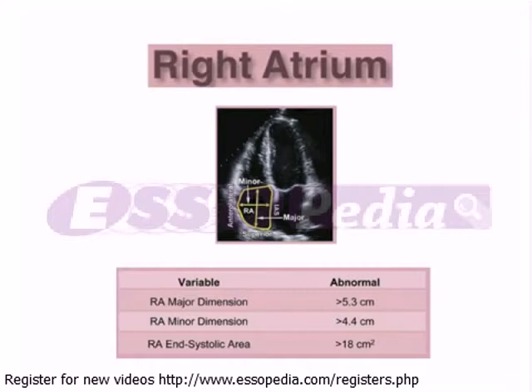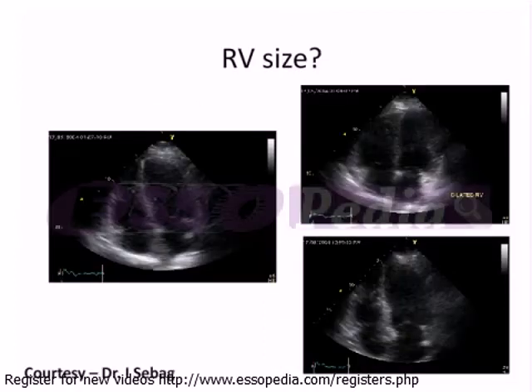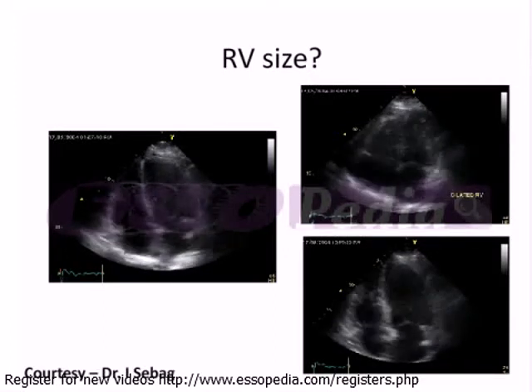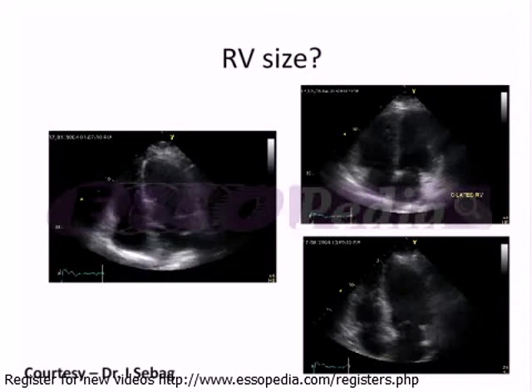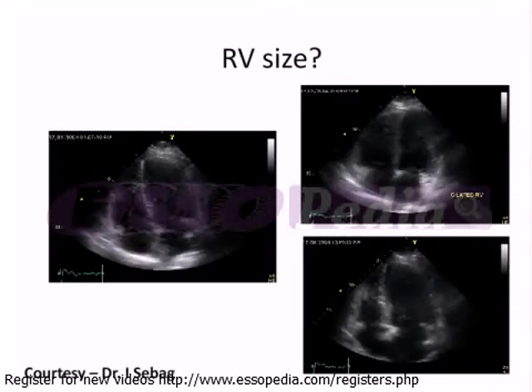Another important and seemingly simple measure of the right ventricle is the right ventricular size, yet practically the assessment of this is not straightforward. It can be measured in the parasternal long axis and parasternal short axis with an upper reference limit of 26 millimeters distal and 33 millimeters proximal, or in the apical four-chamber with an upper limit of normal of 42 millimeters, or less than 70% of left ventricular dimension. Unfortunately, commonly it ends up being a gestalt assessment. That is, does the RV look big?